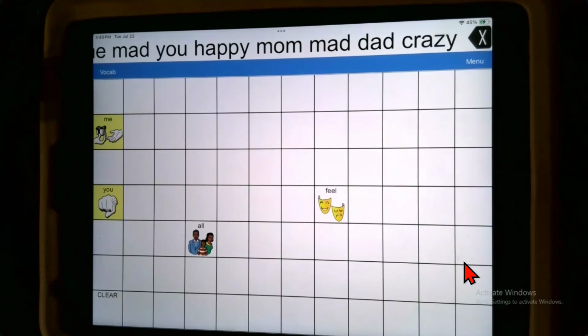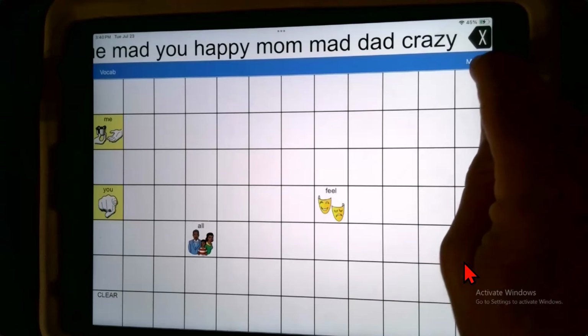All right. What if this was something that you created for one kid and you really liked it, and you have 3 iPads in your home, and you want the kids to play with each other with the other iPads so they can model the device. So you want this vocabulary builder file on the second iPad. Here's how you share it.